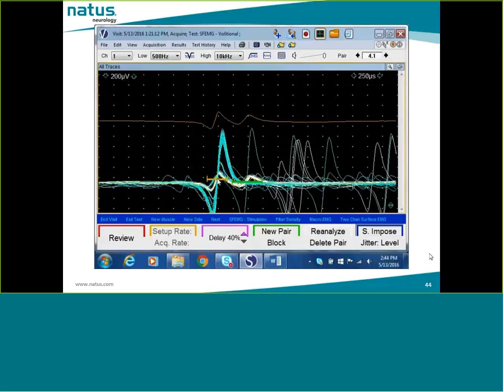So I will click on it, drag it over here. It's roughly halfway between the peaks. And the position of my stop window appears satisfactory. I'm not going to bother to change it.